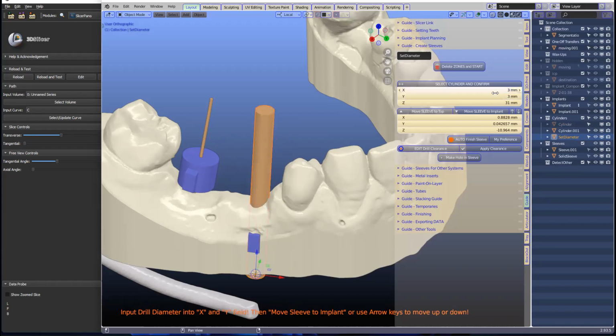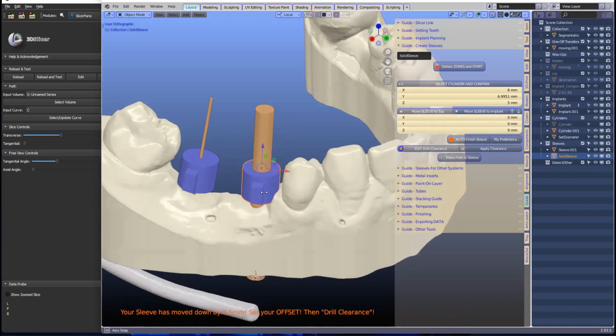So you're going to have to know how big you want this hole to be, basically. The drill bit, or your guided shank. Then we're going to move this up. This works in increments of 0.5 up or down. A lot of them are around about 9 millimeters.